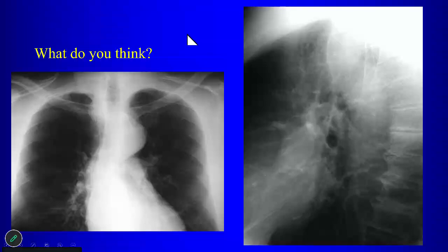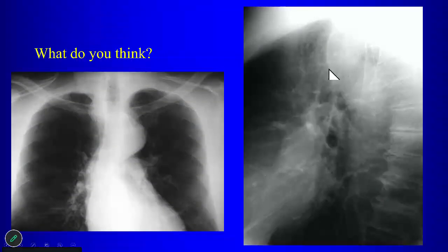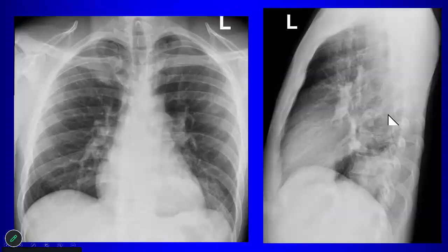What vascular anomaly? Aberrant? Which subclavian? Right, left. Which one? What side is the arch on? So which subclavian would be aberrant? No. The aberrant subclavian is the side opposite the arch. So if you have a left arch, it would be an aberrant right subclavian. All right? So that's an aberrant right subclavian artery that goes behind the trachea and the esophagus, and that can cause that smooth indentation on the trachea. So when we see that on the lateral view with something back there, you can think of an aberrant subclavian artery. Okay.